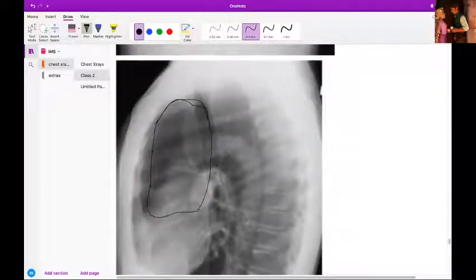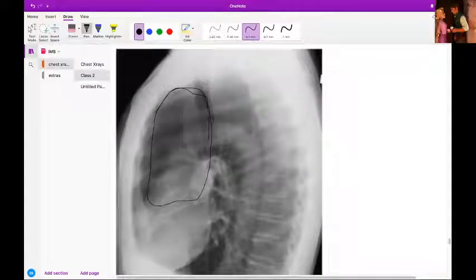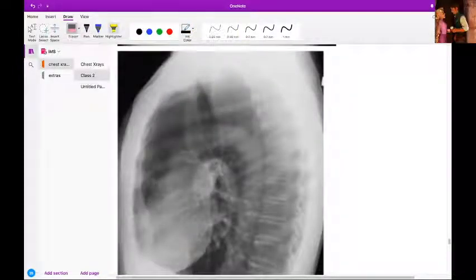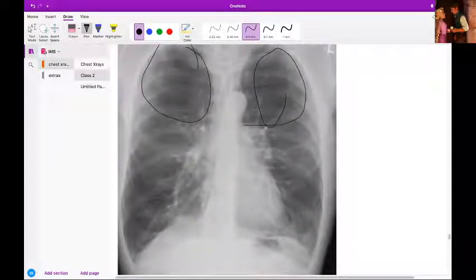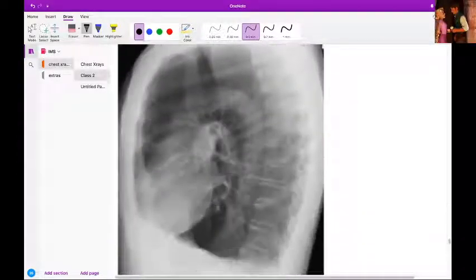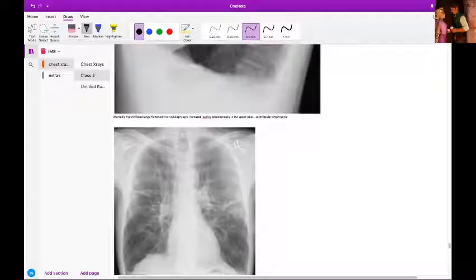So if the upper lobes are more translucent and the emphysema is more in the upper lobe, then it's mostly centrilobular emphysema. If you're not able to see it, you can see it in the file that I will send. Last time when I was looking at it, it was clearer, so I think it's because of the stream. So that is centrilobular emphysema.